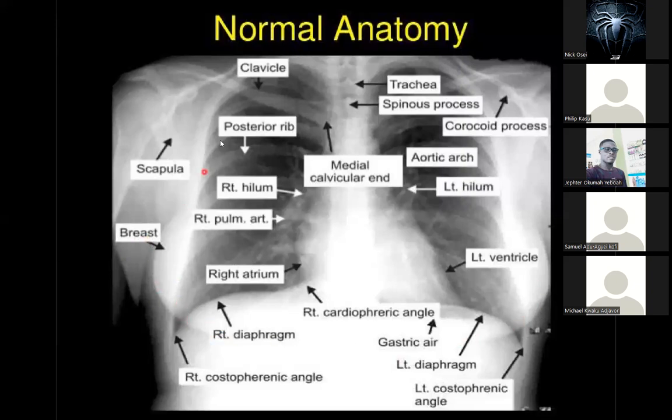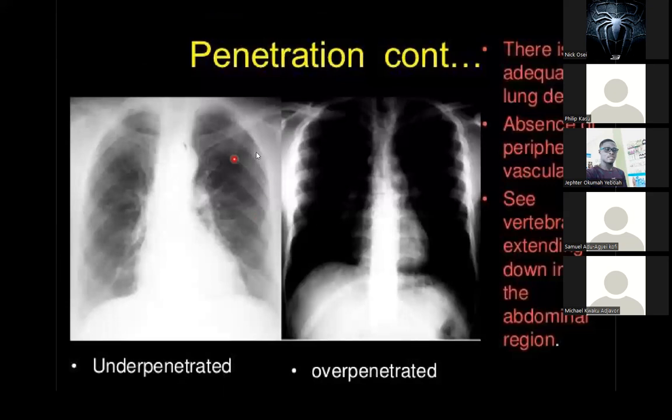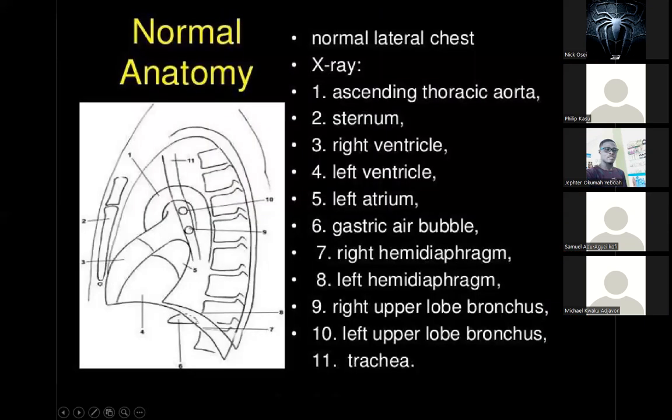So you realize that if I should give you this X-ray to label in an exam, it's fair, isn't it? Because everything here is quite easy to tell. Okay. So that's about it, I'm sure we'll see others on the way. Okay, so we mentioned under penetration, over penetration, so I won't waste time on that.